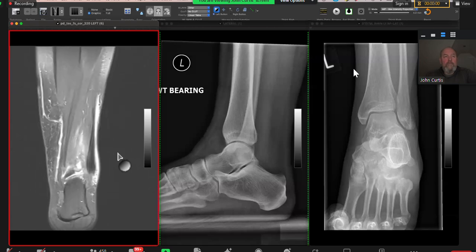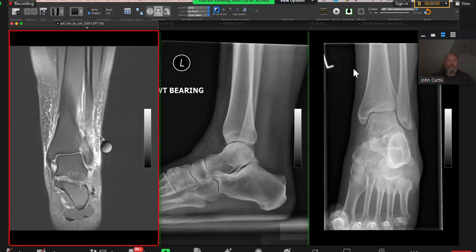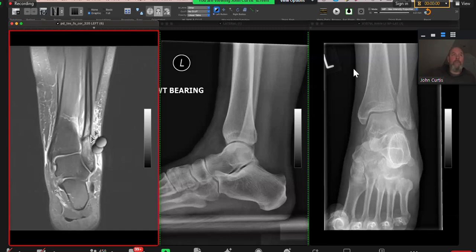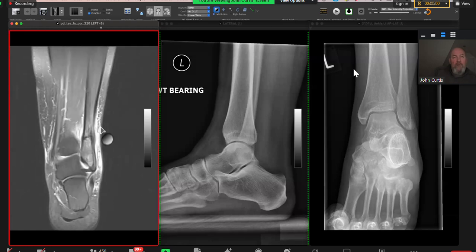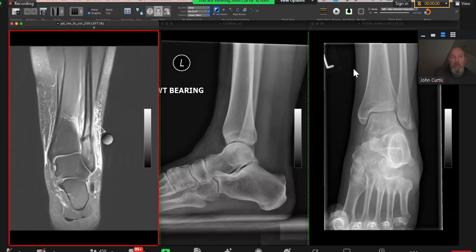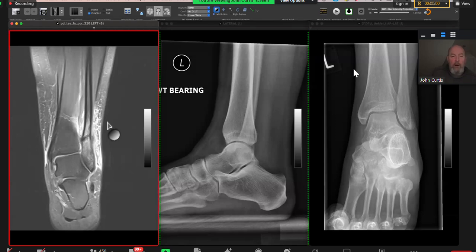Okay, so I can see that there's an altered MR signal intensity area that is noted within the distal aspect of the fibula that is linear and likely representing a fracture, and surrounding edematous changes in the soft tissue as well. Would you be worried about the surrounding high signal change? In other words, would you be worried it might be a malignancy? I think I would. A yes or a no, not a maybe. Okay.